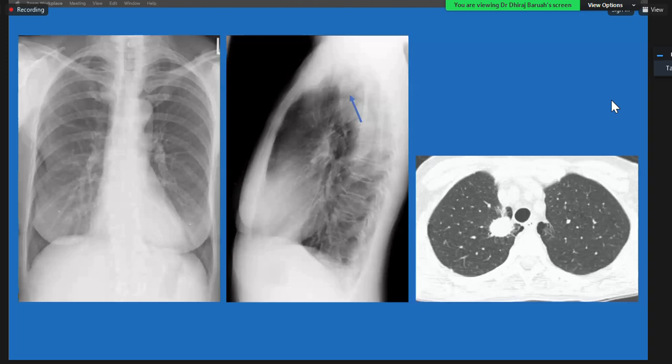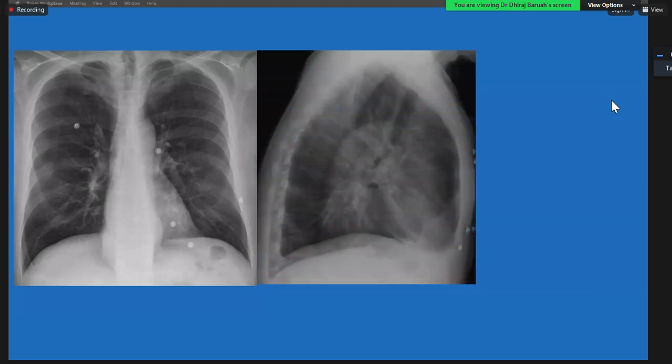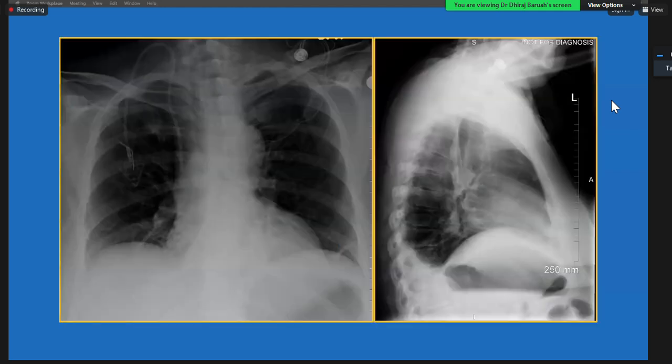So first you looked at retrosternal, then you looked at retrotracheal. When you are in that area, you see how thin that tracheal stripe is, yeah? If you look here, this patient has a thick tracheal stripe, okay? This patient has had a gastric pull-up for esophageal cancer, but that tracheal stripe, compared to this one on our left, is not normal. So you will have to look at that stripe and look for any thickening of it, like in this case. There may be different causes, but if you see thickening, that means it is not normal, okay?